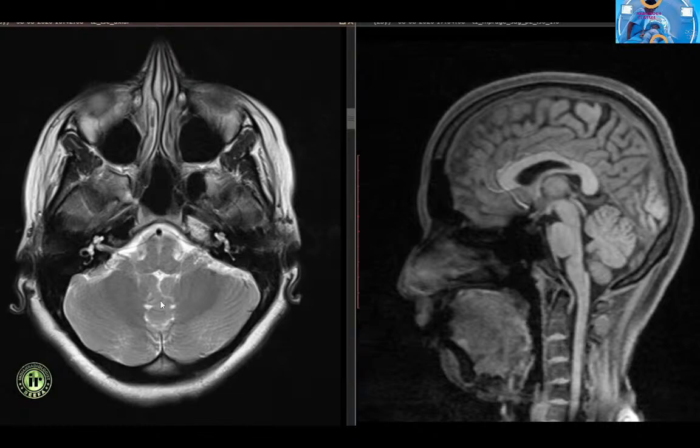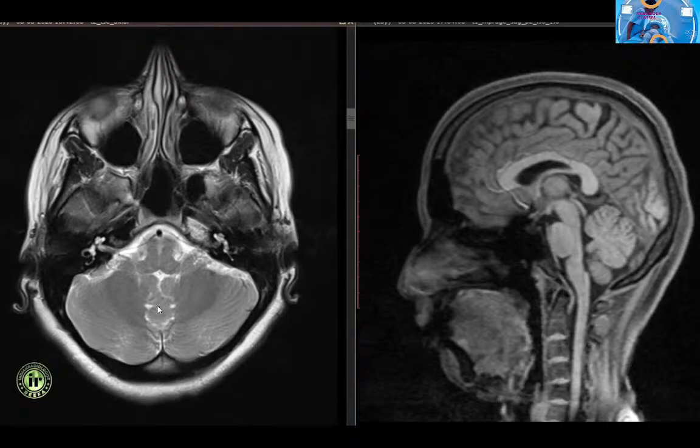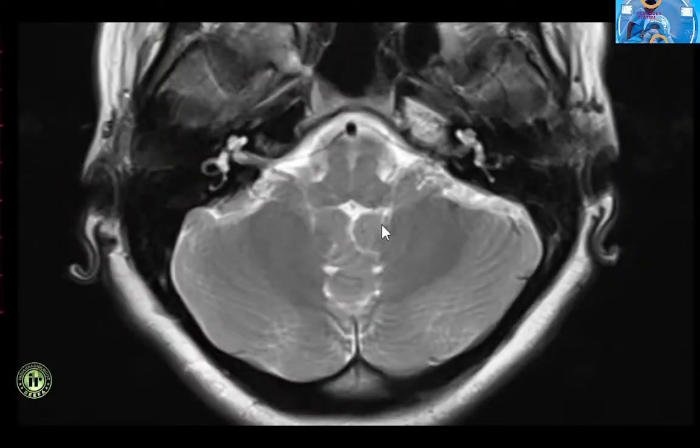The nodule is the only lobule of the flocculonodular lobe and can be identified posterior to the 4th ventricle. The flocculus is largely separate from the rest of the cerebellum and can be seen extending laterally inferior to the vestibulocochlear nerve. The cerebellar tonsils can also be identified lying posterior to the medulla.